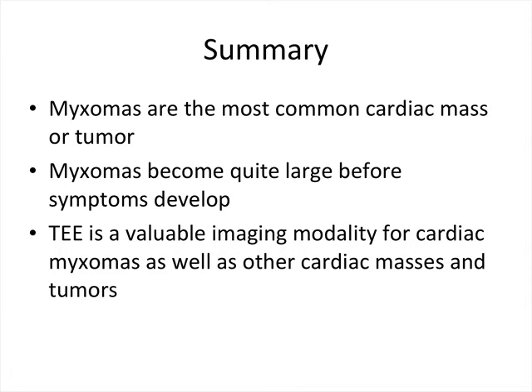TEE is a valuable imaging modality for not only myxomas but other cardiac tumors as well, due to the capability of positioning the TEE probe close to the tumor or mass of interest. TEE is also helpful in evaluating the success of surgical resection of the tumor.